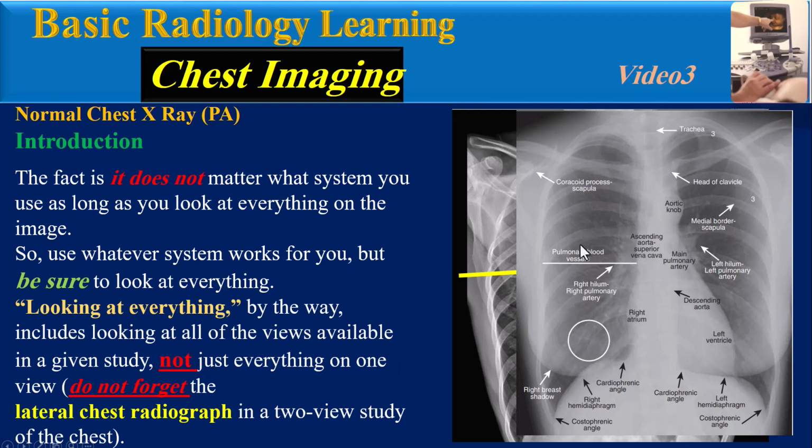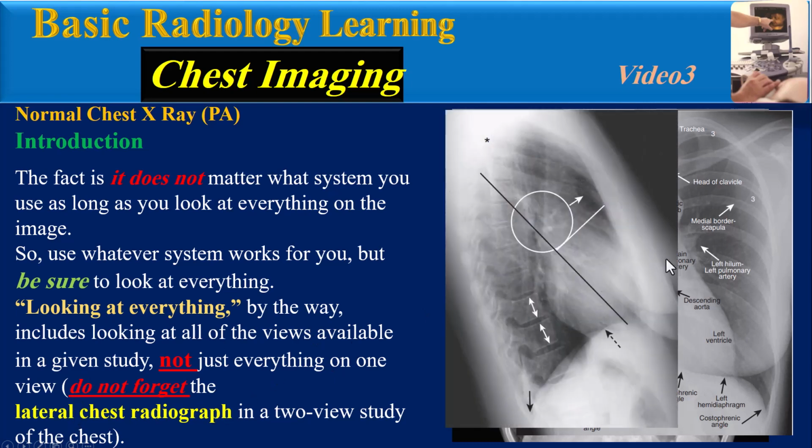Looking at everything, by the way, includes looking at all of the views available in a given study, not just everything on one view. And don't forget the lateral chest radiograph in a two-view study of the chest.